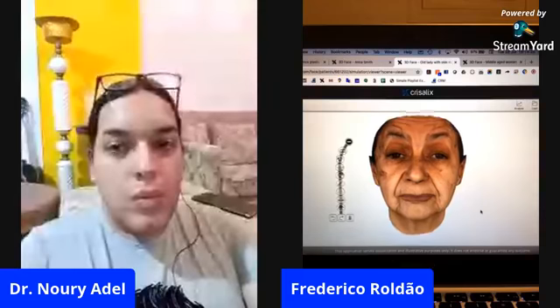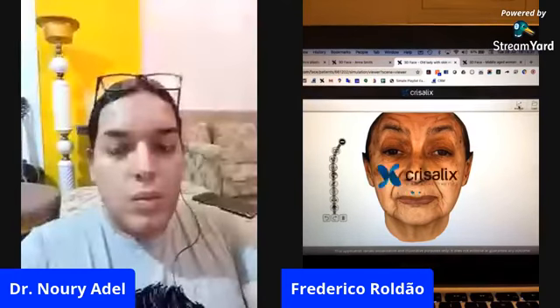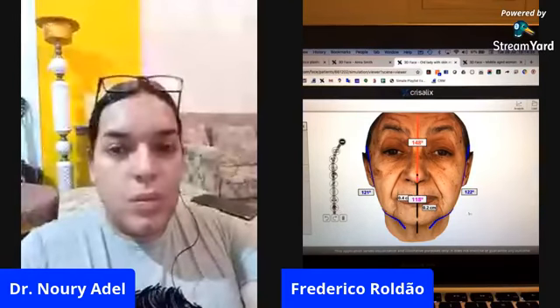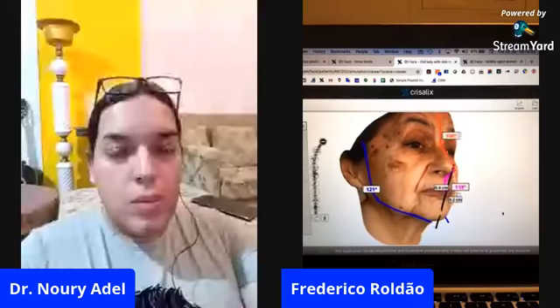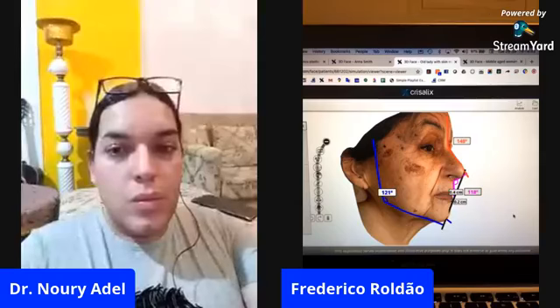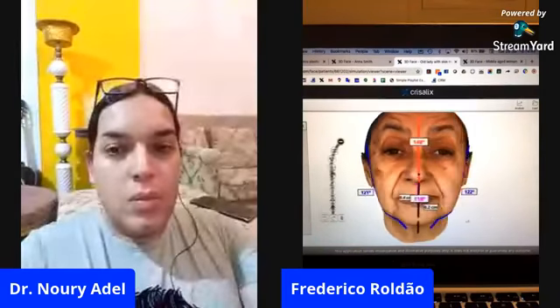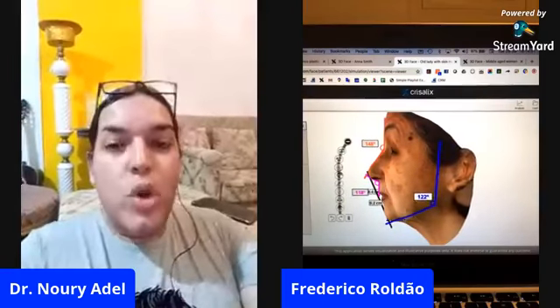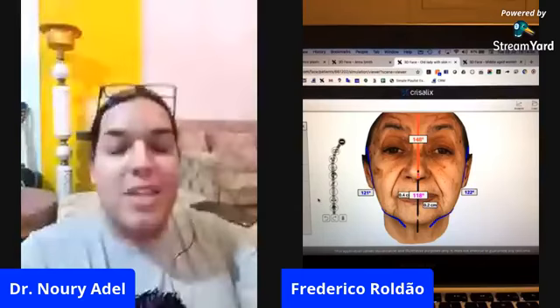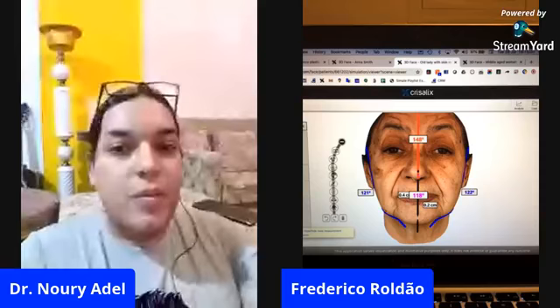Let me zoom in a bit so that we see the lady better, okay? And I will start, if you allow me, by using these analysis tools that will give you some information about your patient's angles. I believe anyone dealing with aesthetic procedures on the face would find it useful to have these angles in order to analyze, because we always talk about the normal facial ratios and normal facial proportions. It's amazing how with software you can fully measure exactly those angles and planes.